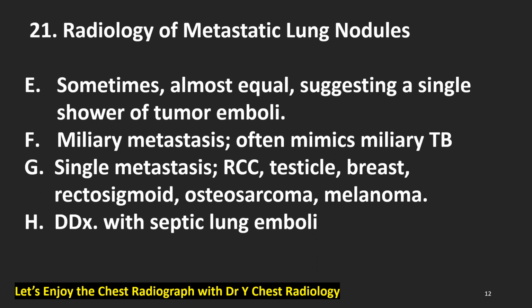H. We need differential diagnosis with septic lung emboli. Sometimes they are very similar, sometimes very clear.